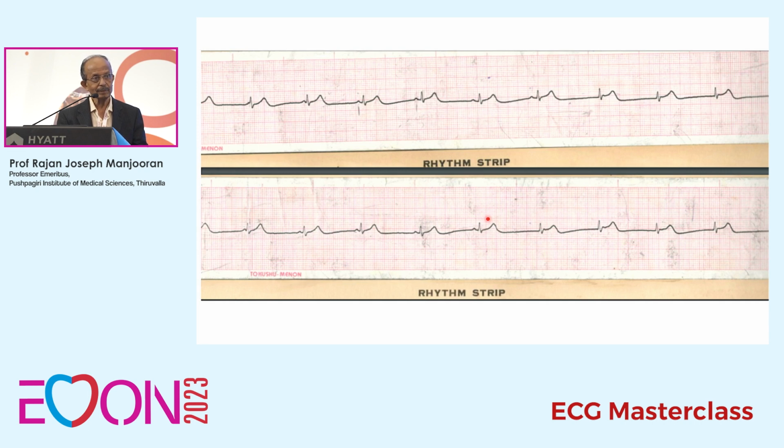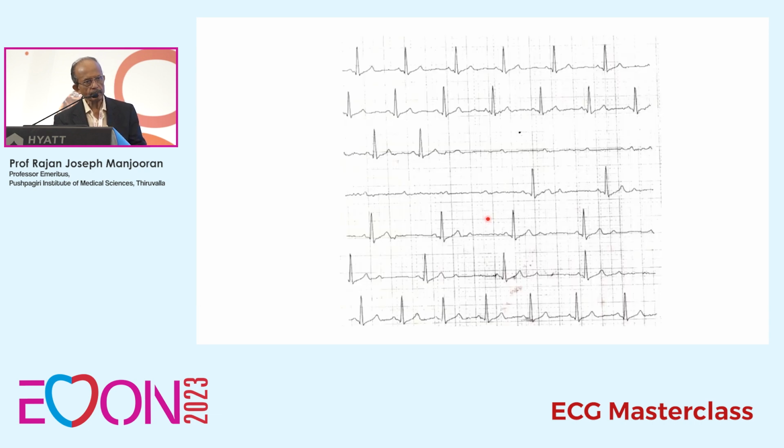What is the diagnosis? DM student? What is the diagnosis? This is known as isorhythmic AV dissociation, where the P wave marches into the QRS complex, goes beyond and gets out. Oh, this is a very interesting ECG diagnosis. This is a very unusual arrhythmia, not a common one.